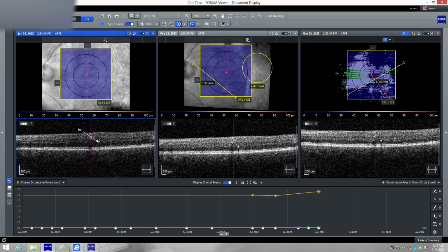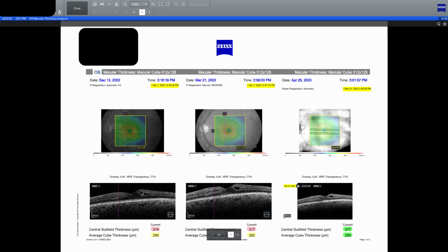Of course, there is a way to modify the images. You can put names, you can put measurements, you can put circles, you can measure the OCTs, but you can also draw on the SLO as well. After you are done with image analysis, you can naturally print them or store them as PDFs. In that case, you are going to have two-page reports. One page is going to be the images, the other one is going to be a graph. Moreover, you can store them in DICOM.